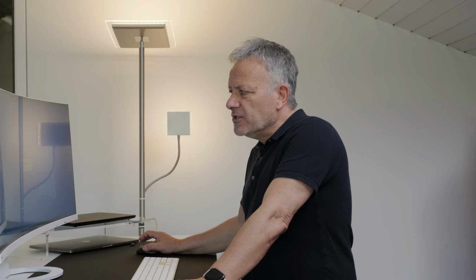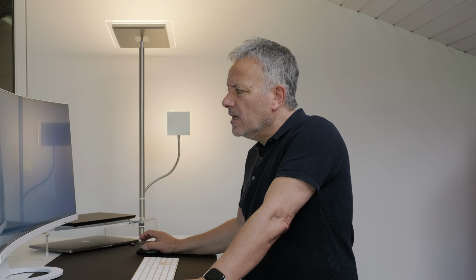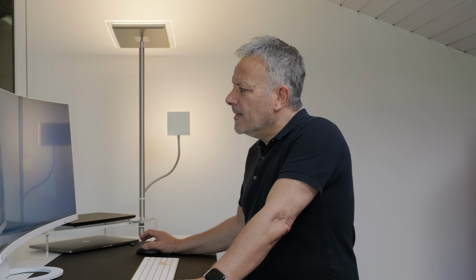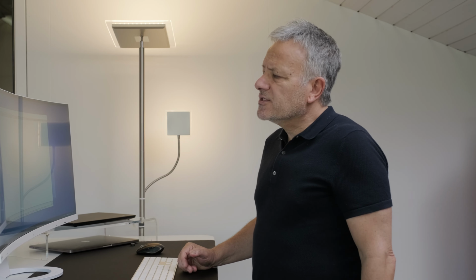The BESA that we are using at the moment is version 7.1, which has some added new features. BESA is a really nice software. It's not free. It can be used to do quite a lot of stuff like source analysis. It can also do MRI co-registration, etc., etc.